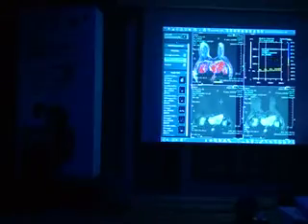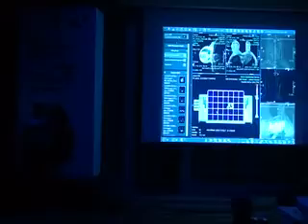And finally the last step, which is the interventional tool, a very nice and easy tool. Just move the cursor on a lesion, for example here, and then you will see in this grid exactly where the needle should be inserted, and to what depth, just to be sure that we are reaching the proper point in the breast where there is a lesion, and to be much more accurate.